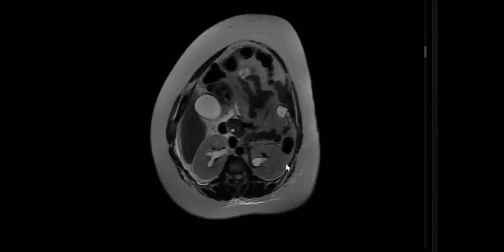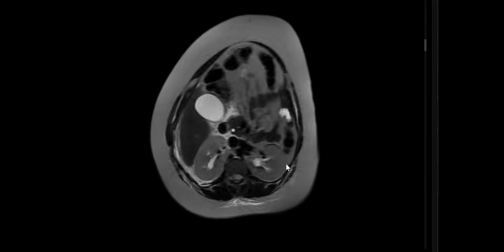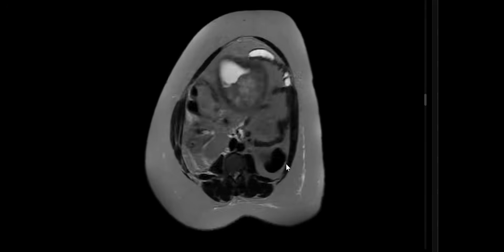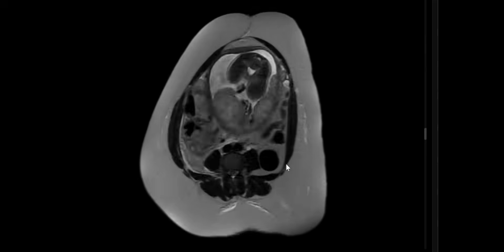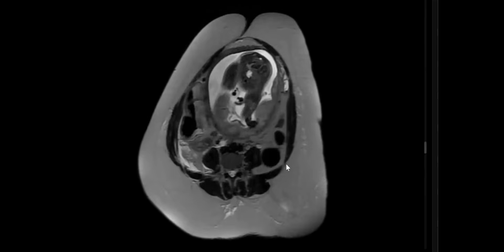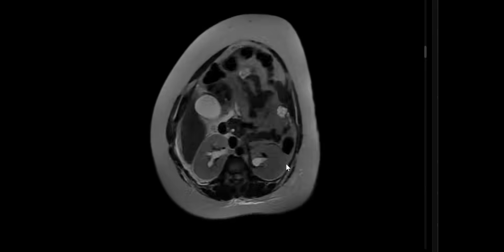Good. So the gallbladder looks good. Right kidney unremarkable. No collection beneath or below the liver, as in case of perihepatitis or Fitz-Hugh-Curtis syndrome. Downwards, I will check the right ovary for any ovarian torsion, which may occur also. Any ovarian vein thrombophlebitis, smudging fat planes along the right psoas.